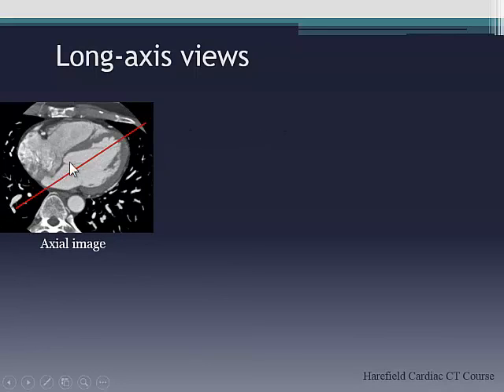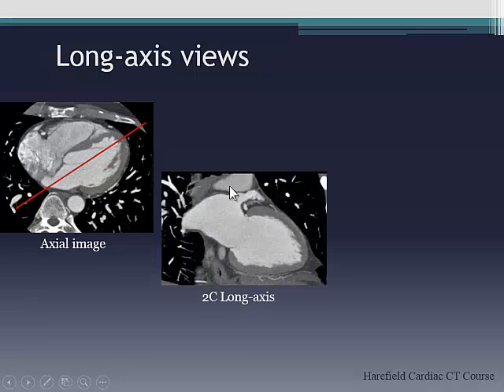When we cut through the mitral valve annulus and the LV apex, we're correcting for the first plane of obliquity, which gives us the vertical long axis or the long axis 2-chamber. Remember, this is not a proper 2-chamber because in a proper 2-chamber on echo or an MRI, you should really be cutting through the anterior and the inferior wall, okay? Because you've not planned this off the LVSA, you can't guarantee you're cutting through the anterior and the inferior wall. And in fact, when you actually look at a subsequent 2-chamber, you'll often see that this is sometimes cutting through the inferoseptum even, or close to the insertion point. So it's well worth, when you're doing MRI, for example, not being lazy and settling for the vertical long axis, but actually to plan a proper 2-chamber.